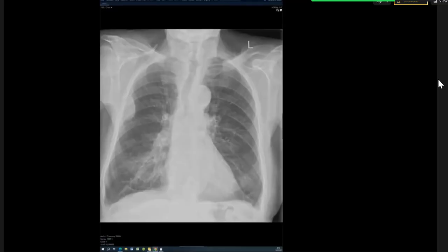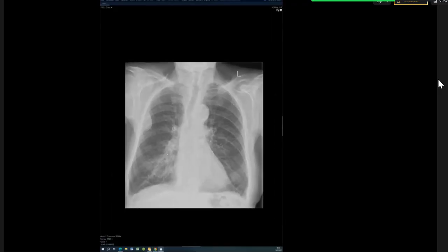Is the lower right vasculature on this chest X-ray normal? Yes, it is normal. This one on the screen right now, this is normal. With age, you get this sort of blunting of the diaphragms bilaterally quite commonly. But like the last candidate said quite rightfully, you have to say it could represent a small pleural effusion, but this is just common pleural thickening in elderly patients. This right lower lobe vessel can look quite prominent in many people, but this is normal.